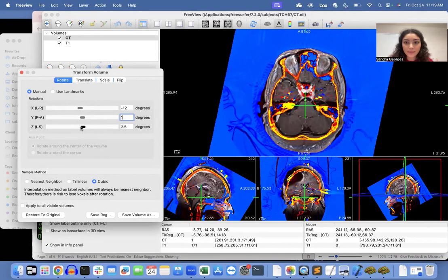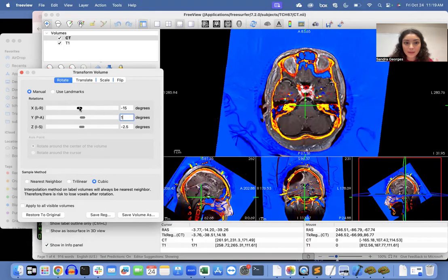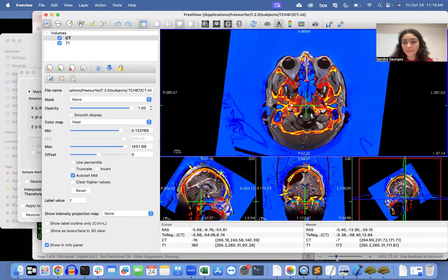Might be, there we go. And this is looking quite a lot better, I think. Here we go.